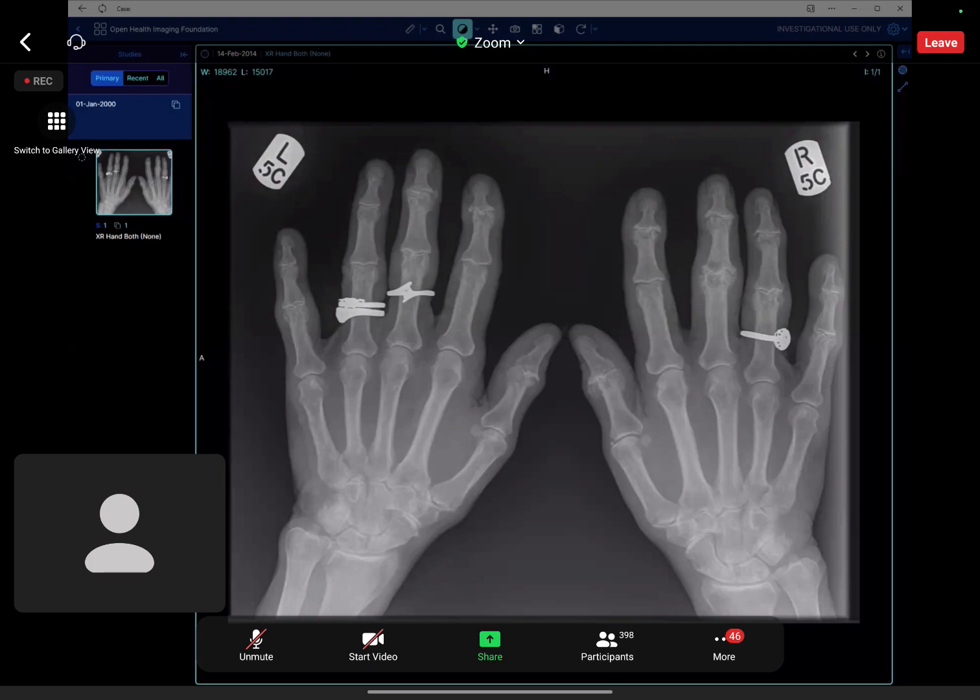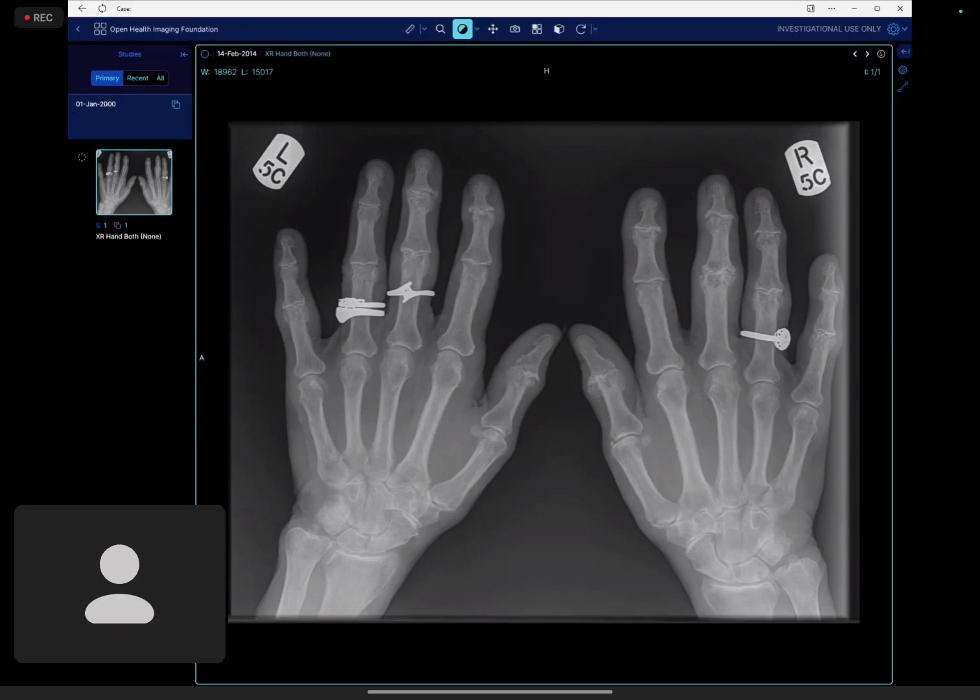So there is involvement of the distal interphalangeal and proximal interphalangeal joint spaces. I'm suspecting that my first differential may be osteoarthritis, given that there's sparing of the MCP joints. Other differentials are psoriatic arthritis.